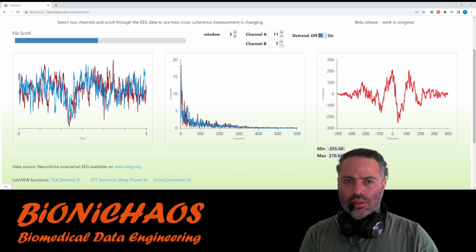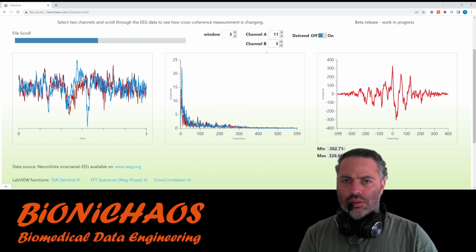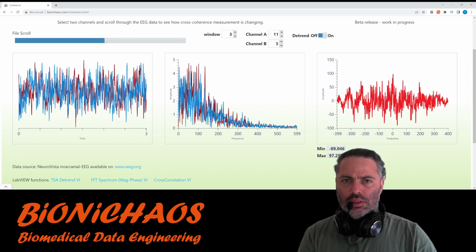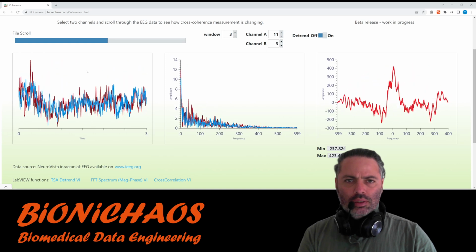Yeah, this one shows 4 Hertz phase difference correlation, large peak there. So the two channels essentially have the same features. Yeah, you can see it more clearly there. You have this large peak, 26 Hertz. Yeah, so your window size makes a lot of a difference.